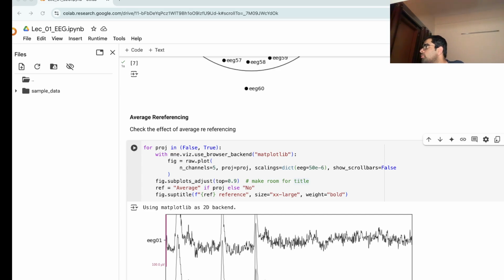So probably explaining the data set might help, like how this FIF file stores things and what kind of data sets may go into it. That will give them an idea. This is a data structure which we can't read through other software. You need the MNE plugin to do that, right? Yes, yes, any library.